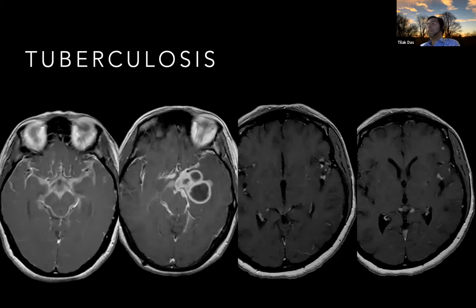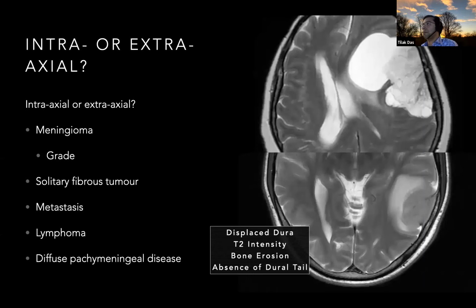And with leptomeningeal disease, it tends to be more infection and chemical meningitis rather than carcinomatosis when compared to pachymeningeal disease. This is a classic TB example where all the enhancement is down in the base of the brain, which then develops into tuberculomas. But this is also another example of TB. It's not always so obvious with small leptomeningeal nodules. Okay, so that was a pretty quick run through.